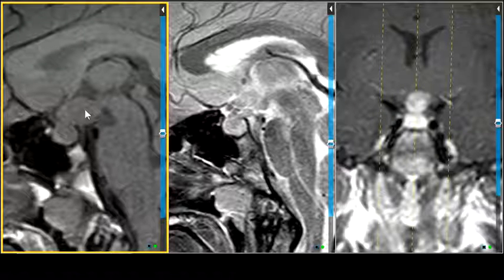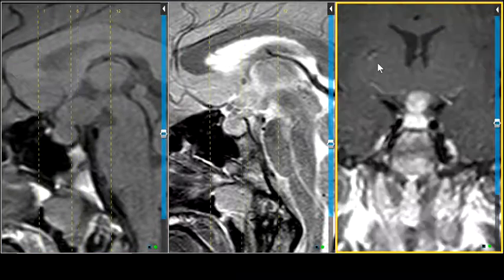And in my simplistic mind, I think what you were saying is big suprasellar lesion, young, otherwise healthy person, it's a juicy sella, but it's not really a sellar mass. Right. Almost everything we're seeing is up here, and maybe it's infiltrating down below, maybe not, but it's not producing a heck of a lot of expansion. So germinoma is something to strongly consider here, and diabetes insipidus is particularly prevalent in patients that have germinoma and stalk-related disease. Now, I guess hamartoma, the enhancement kind of rules that out.